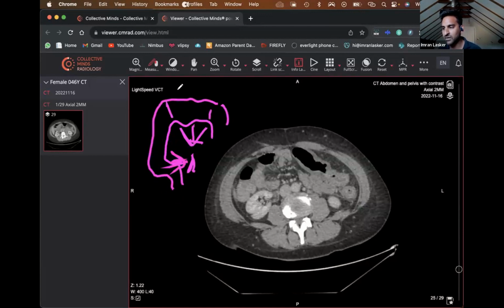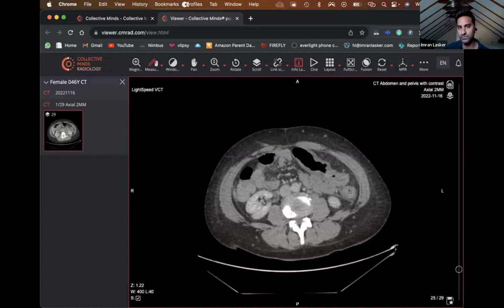And then you get a bit of overlap here called the watershed area, where a few vessels from one area and a few vessels from another result in some sort of cross vascularization. In this particular case, what I was going to try and show is that this does have a bit of a distribution to do with the splenic flexure all the way down to the sigmoid colon.